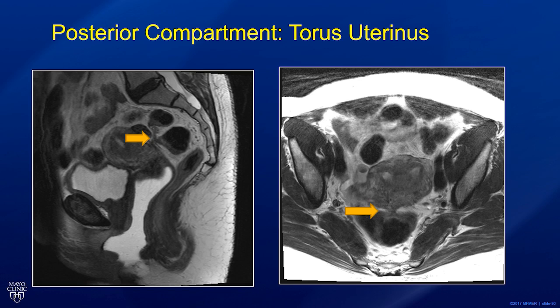And this is a really common appearance, and you want to very closely interrogate the rectal serosa to see if there's any deeper involvement, which can sometimes be challenging with small lesions. And as they become larger, our degree of confidence increases.